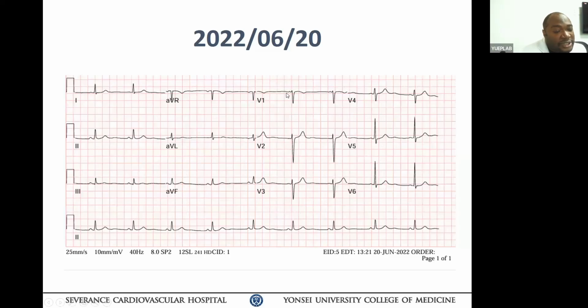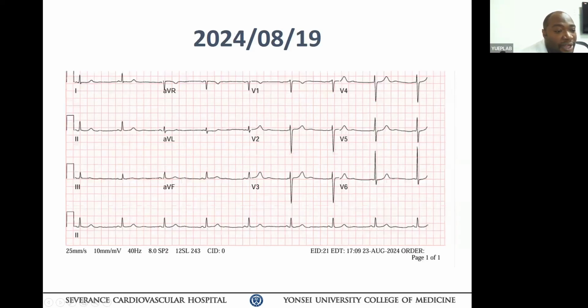It's a bit difficult to see. Looking up close, this area looks a bit hazy, but it's not a clear, distinct wave. Over here, it's a bit more prominent. The activation here is sinus rhythm. We see a P deflection here and another one here. So this may have been one of the first signs of this interatrial conduction effect.